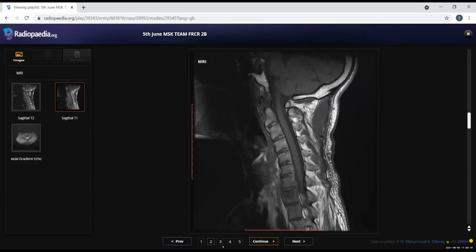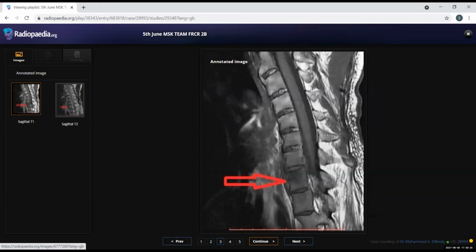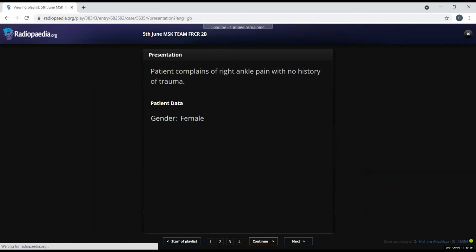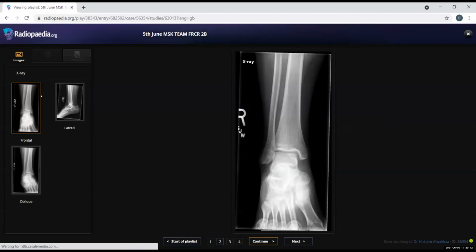When this Romanus lesion heals, that is, there is sclerosis, then it becomes the shiny corner sign. And the Anderson lesion is actually the pseudoarthrosis, which develops in this completely ankylosed spine. So these are terms which we have to keep revising, because they really become confusing, but rightly said. This one, you nailed it, as we saw in the previous sessions, as previous hot seats as well.